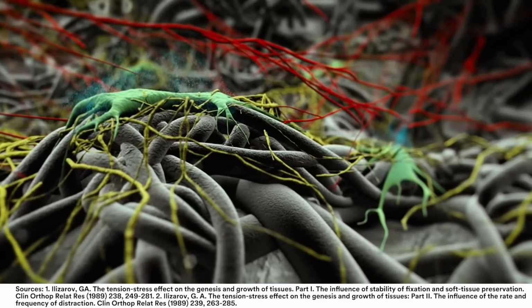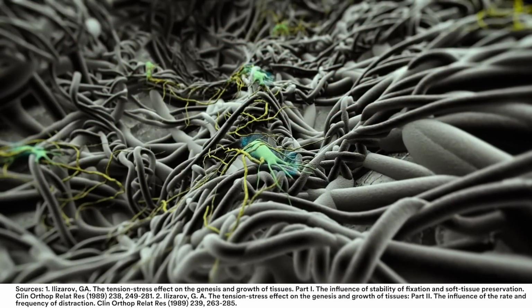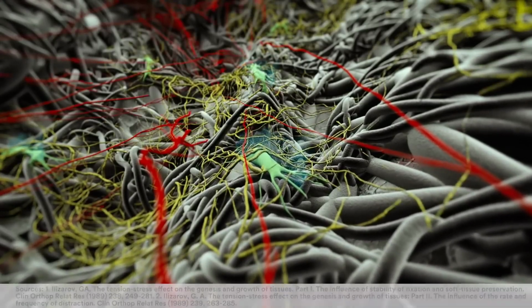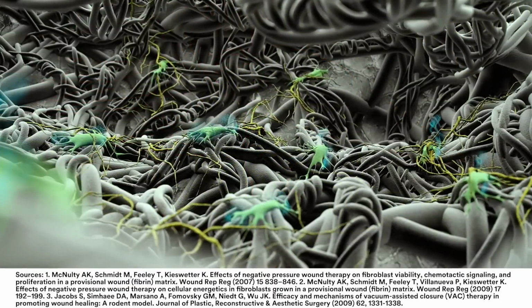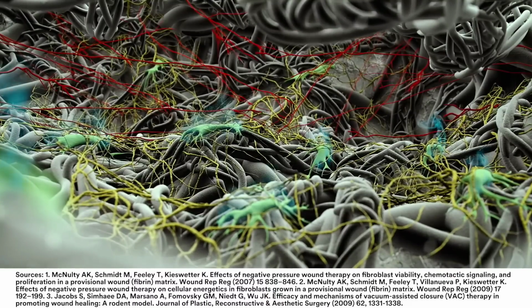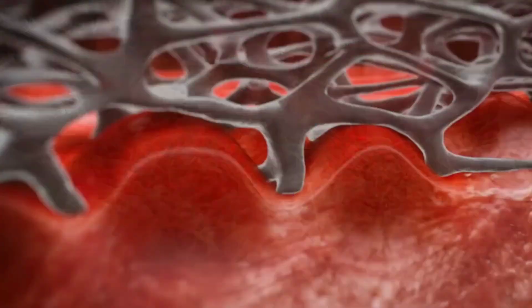This response to cell stretching has been well documented and is clinically used, for example, when tissue expanders are applied to stimulate the formation of new skin. In vitro and in vivo studies conducted using negative pressure have shown that these activities include increased metabolic activity, fibroblast migration, cellular proliferation, and extracellular matrix production.